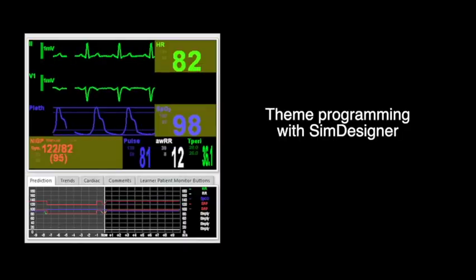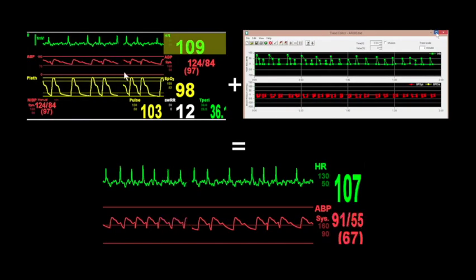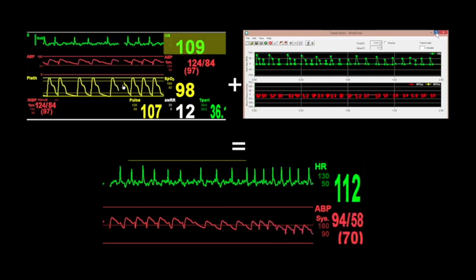Hi, this is Chong. This video is dedicated to SimOps or anybody who has interest in simulator programming with the Laerdal LLEAP system. In the previous video, theme programming with SimDesigner demonstrated parameter synchronized oscillations by blending themes with trend.